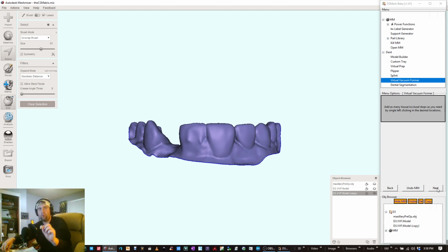So that was a little wax-up that I had. And then here's a thicker one. And this is an indirect bonding tray that I did as well. You can check out my live stream. Both of these I actually designed on my live stream. But that's when I realized that it needs to be printed out a lot thicker. And that's what this guy is right here.